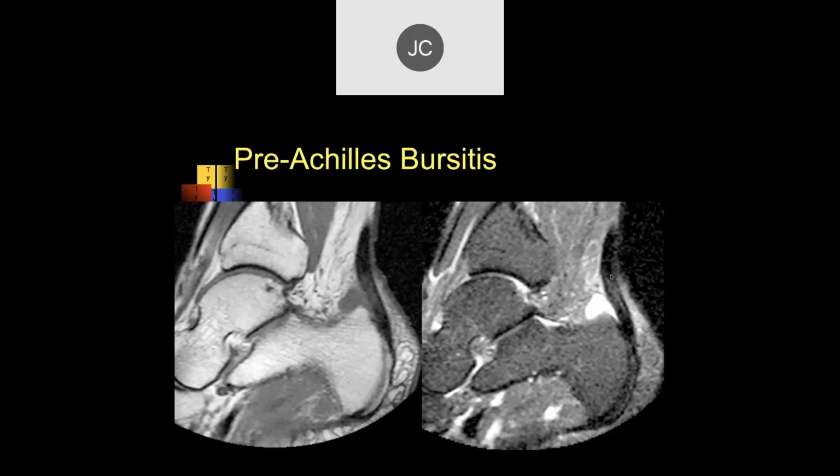I think there are two reasons for that. One could be that you just have traction injury here of the Achilles tendon, which then gives you some partial tears of the fibers here, and you get kind of an inflammatory bursitis due to that. The other very common cause in this area is the footwear, where the back of the shoe presses against the Achilles tendon at its insertion, and you get mechanical irritation of the Achilles tendon and the bursa from the shoe wear. So one thing that people have to be aware of is that shoes can be part of the problem here and have to be evaluated.